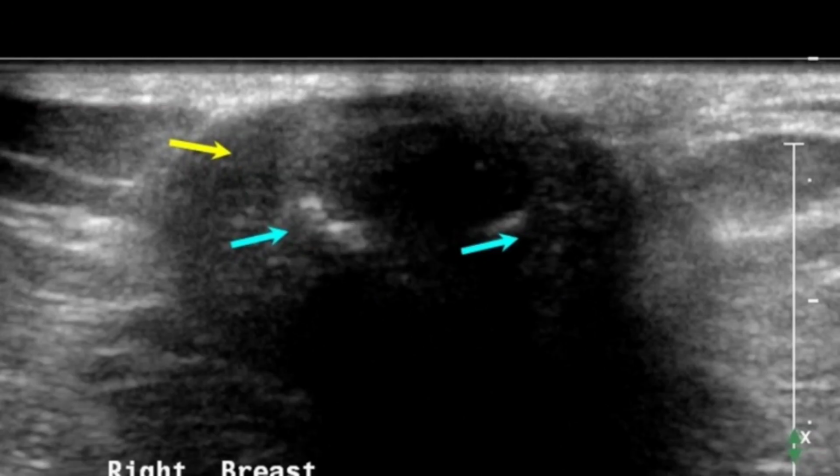Besides all the factors already discussed, it is important to look for some other signs as well. The most important one is calcification, microcalcification. You have to look for microlobulation, intraductal extension, and also infiltration across the tissue planes, which are important points needed to be noted. With respect to calcification, look at this image here.